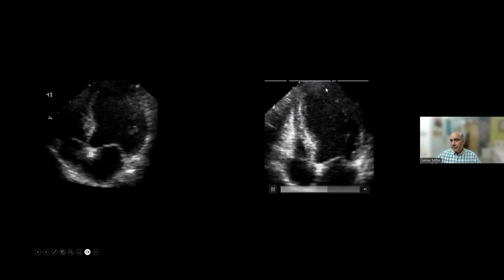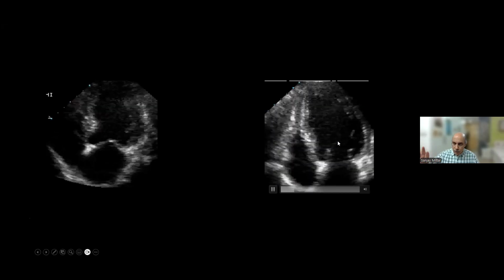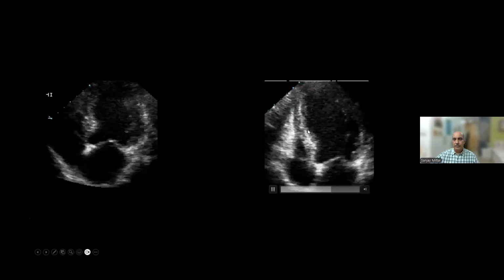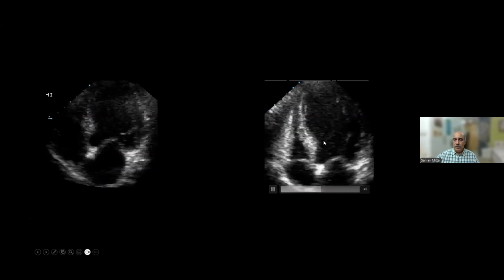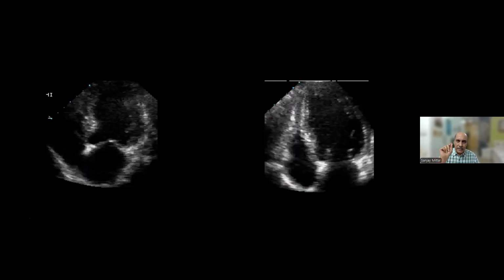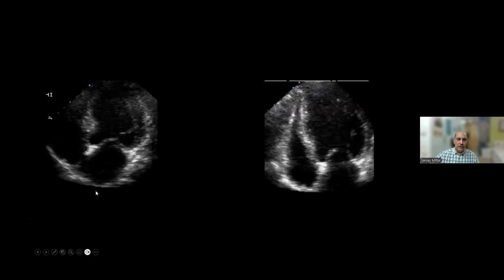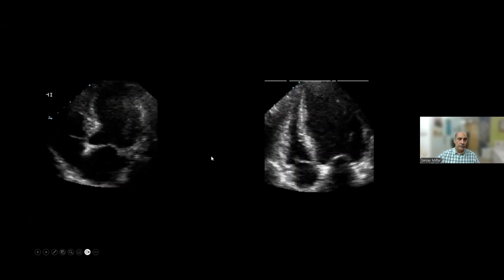And what would be the ejection fraction with this large area? It would be hardly 25%, right? You'll have to only say yes. In your mind, what I am saying is the perception, and this would be around 20% ejection fraction. Can you imagine these two four-chamber views belong to the same individual, and the images had been taken just 5 seconds apart? Can you imagine both these four-chamber views belong to the same patient taken 5 seconds apart, just for the sake of description?